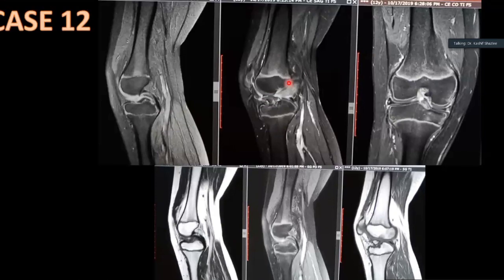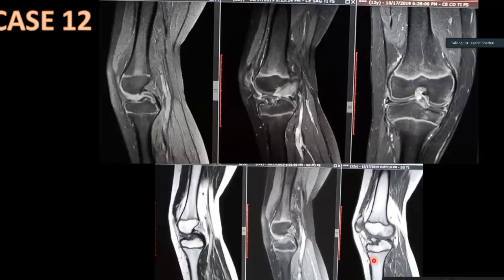The partial tear is there. Look, the anterior half is well visualized, but the posterior fibers are blurred. Okay. Then what is this? So this is a loose body seen within the intercondylar notch. So it's a fracture of the interspinous, the spine of the tibia, where the attachment of the ACL is. Multiple findings. This is a case of trauma.